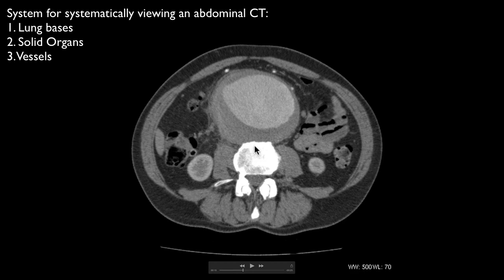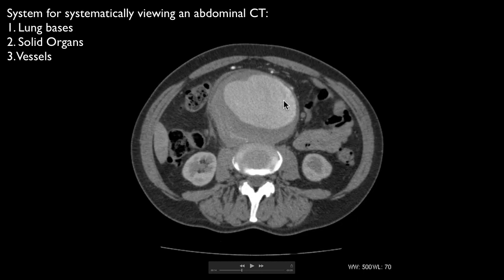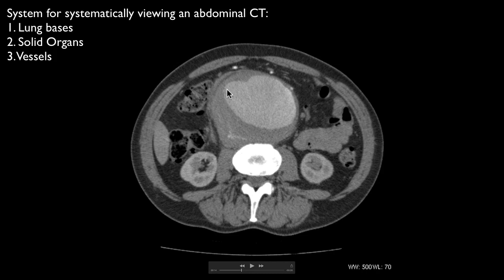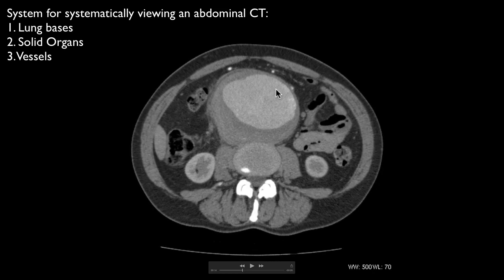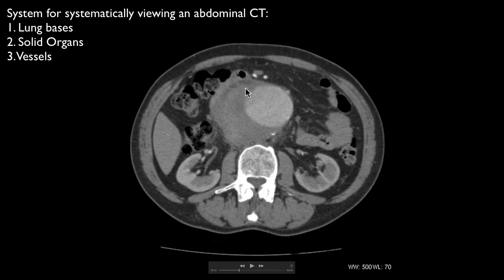So you have impending rupture. You'll have the aorta draped over the vertebral bodies at the back here. So this is one of the lumbar vertebral bodies. You can have an odd morphology to the aneurysm sac. Sometimes you have beaking, or if you've got calcification in the wall of the aneurysm, which you often have, an interruption of that is often a sign of impending rupture. But obviously, clinical findings like a tender aneurysm are equally significant.